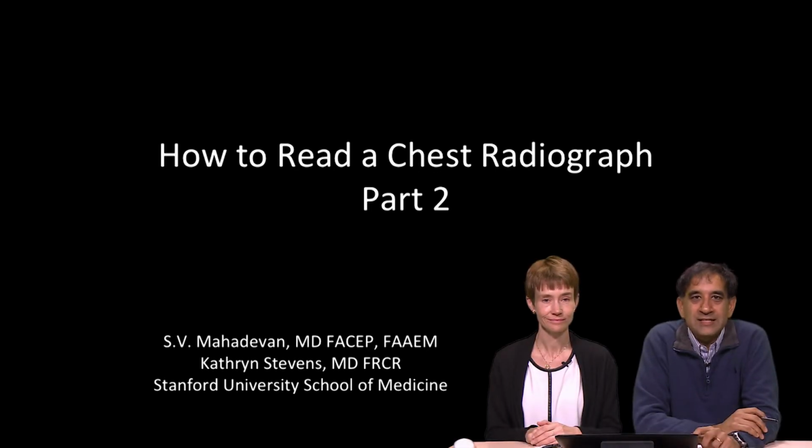I'm here with Dr. Kate Stevens, and we're going to continue on with part 2 of how to read a chest radiograph.